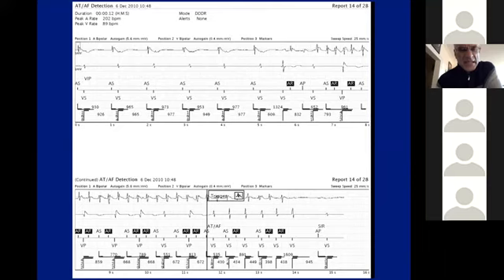So what is this? This is an example of what kind of pacing? It's competitive atrial pacing. So it's competing, and we'll talk about this later. This is an example when this was ignored and then A-paced. And what could have happened because of this A-paced event? You went into AFib or atrial tachycardia? Possibly, yes, exactly. It could have been a trigger for that. But I'm primarily showing it here because of the more organized nature of this AT/AF.